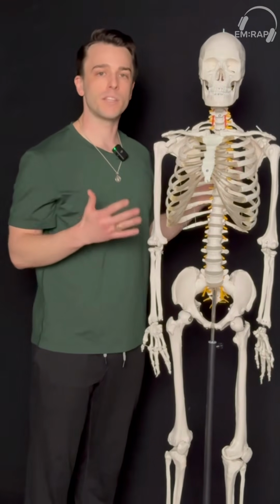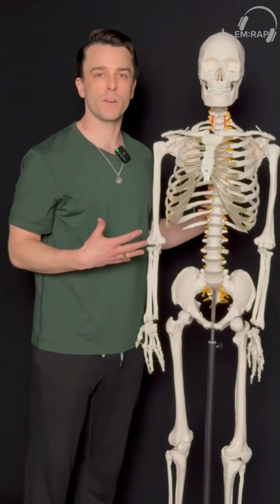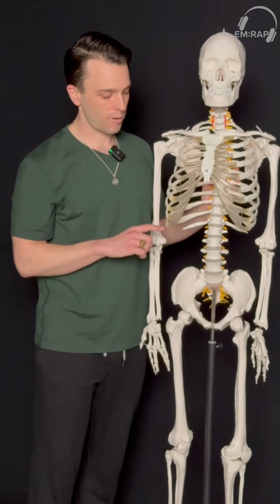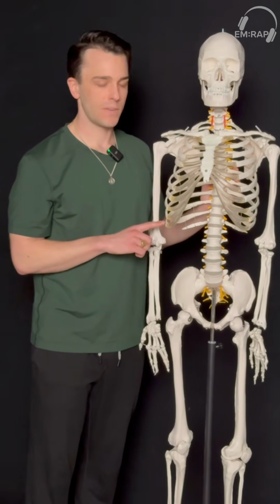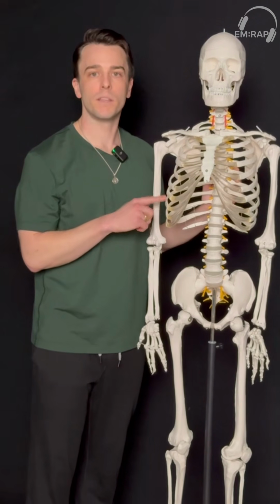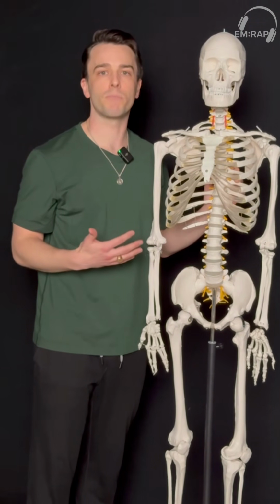After that, we have inspiration, which means the patient needs to take a good inspiratory effort, and an adequate inspiratory effort should show the diaphragm around ribs 8 through 10. If it's past there, that's hyperinflation. If it's before that 8th rib, then we're worried about hypoinflation. Maybe the patient isn't taking a deep enough breath.